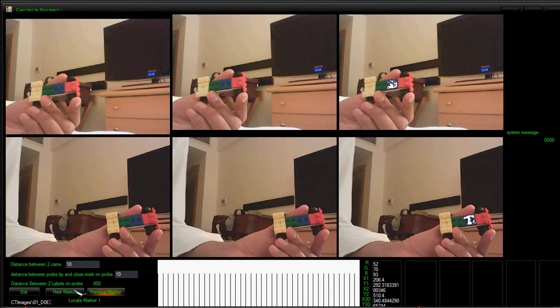Now I'm gonna go for marker number 2. When I press this marker number 2 here, it appears, and this screen freezes. Okay, it's a feedback screen. Now I'm gonna go for the green color, so I'm gonna press here. As we see, those are the green markers.